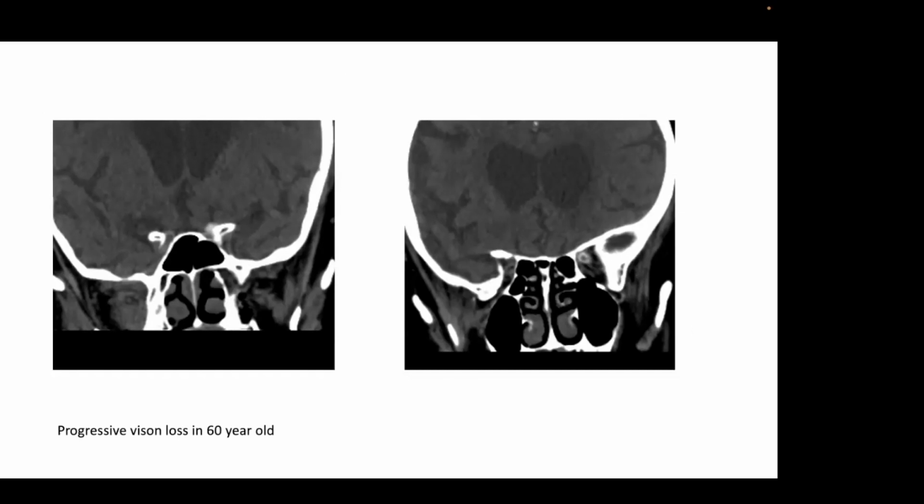All right. Anybody want to look at this case? Progressive vision loss in a 60-year-old. Left eye.